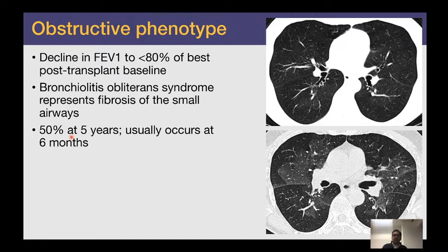Okay, now if you have an HRCT, then you will have expiratory images and you'll be able to see that the areas of dark lung stay dark when the patient exhales, and areas of normal lung become more white when the patient exhales. Okay, and that is the classic sign of bronchiolitis obliterans.